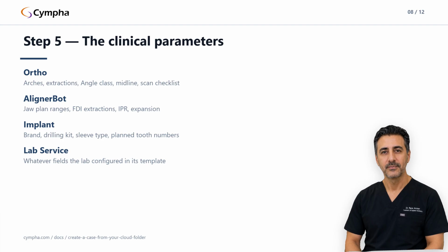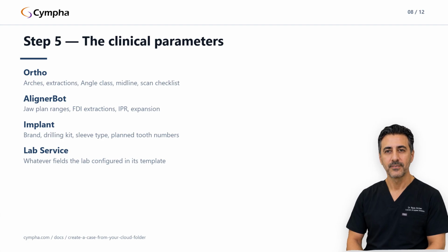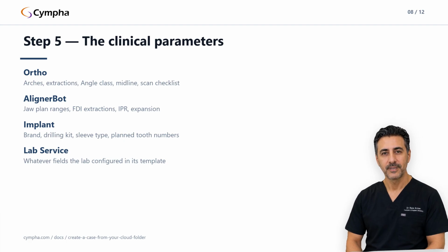Everything filled in? Click Create Case at the bottom. 3 things happen behind the scenes, in order. The case is created in submitted status with the parameters you entered, and it lands with the lab manager. The cloud folder's files are attached to the case. And your browser navigates to the new case's detail page.